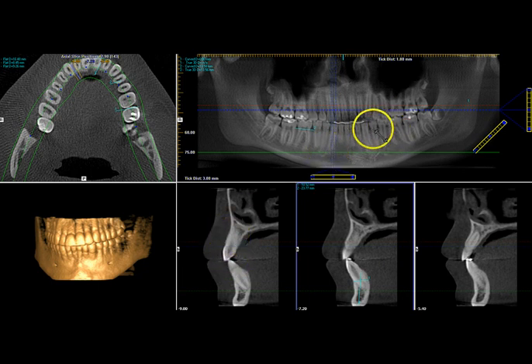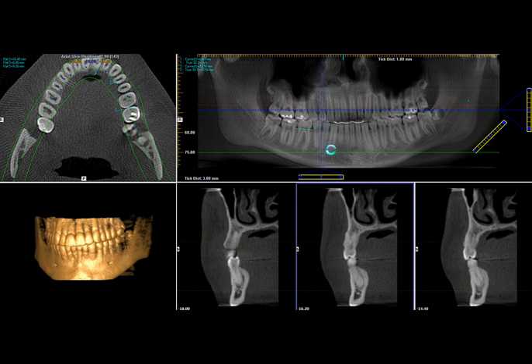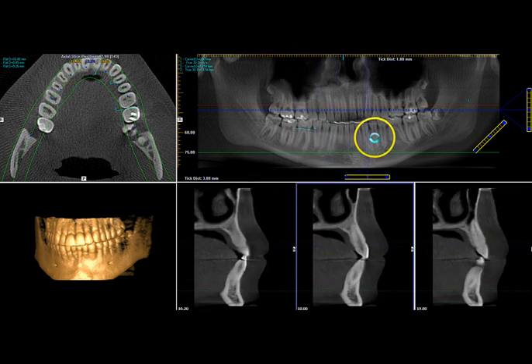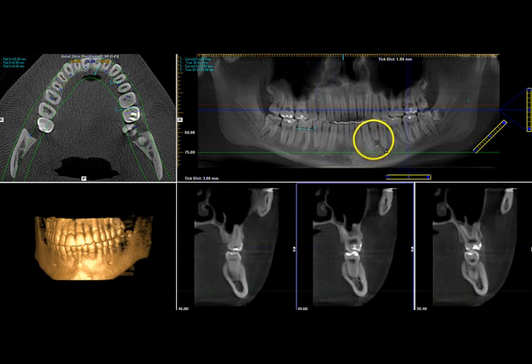So let's go left to right, okay, and see how the sagittal view comes up. The way the cone beam CTs are, it's literally middle cuts right down the middle, right? So when you're going to the back in the molar, this is pretty much like the coronal view. So it's not truly a sagittal view. It just gives you the cross section of the area.